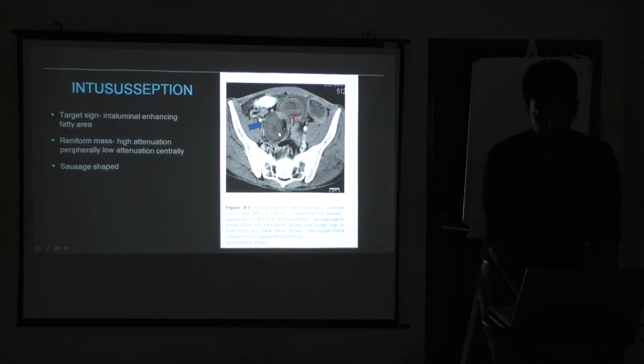In this, again, if you see different shades of grey in one circular area, it indicates something is wrong. Again you should always relate it to the abdominal findings. How does an intussusception patient usually present? He says he's vomiting, the abdomen will be distended, and he'll have one or two episodes of bleeding per rectum. The stool may be black color or blood-tinged. That means we think of intussusception. Like I said, you should always question yourself what you are looking for, then you might find it.